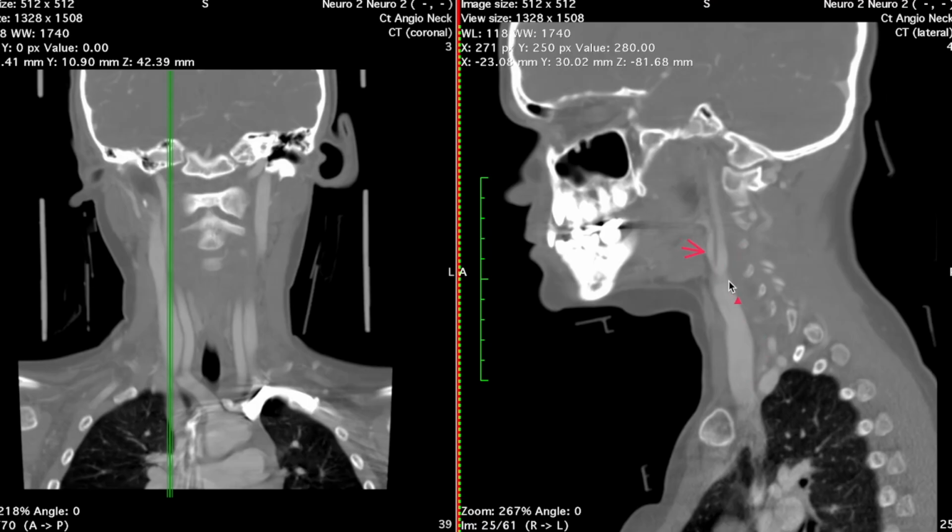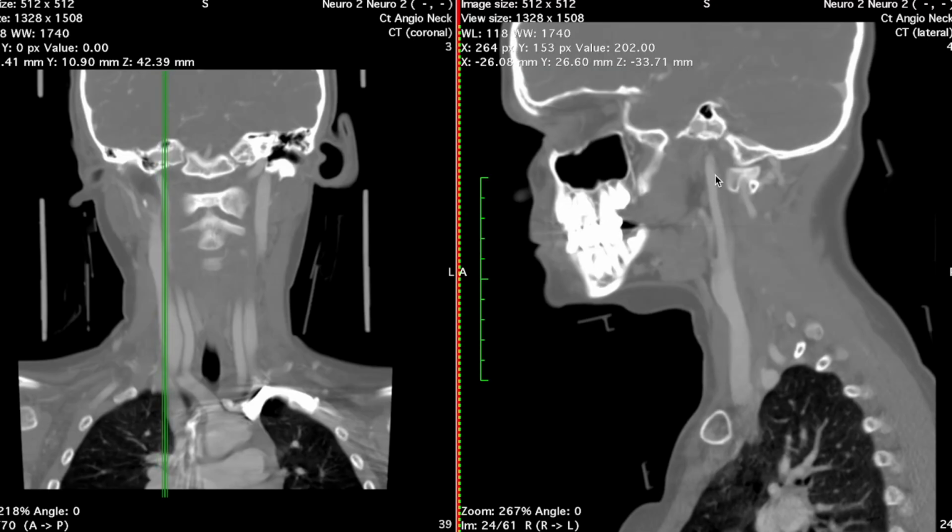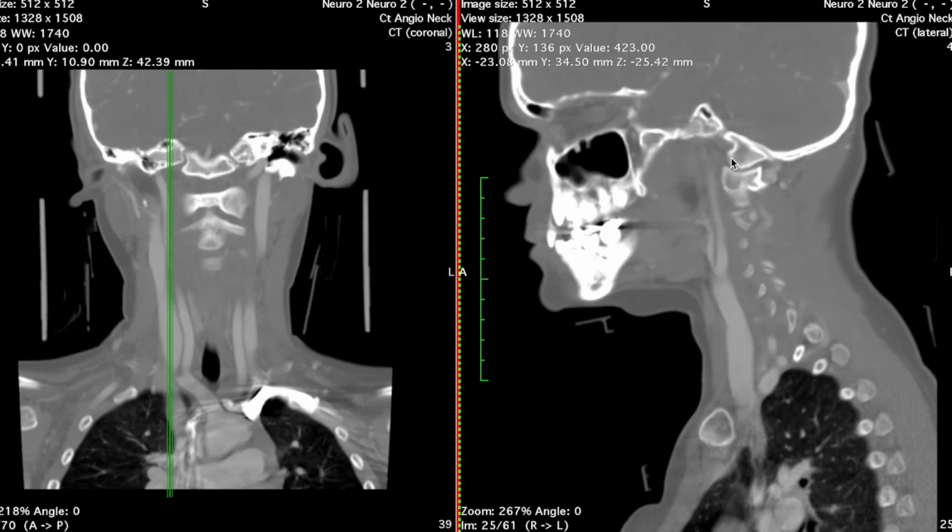This anterior branch is actually the external carotid artery, and the posterior branch is going to be your internal carotid artery. You can tell this because the internal carotid is not going to branch outside of the skull. This is going to be a singular vessel. If I continue scrolling here, this is the internal carotid artery. It doesn't have any branches until it gets inside the skull, which you'll learn more about in your brain and behavior modules. Contrast that with this anterior branch, the external carotid artery.